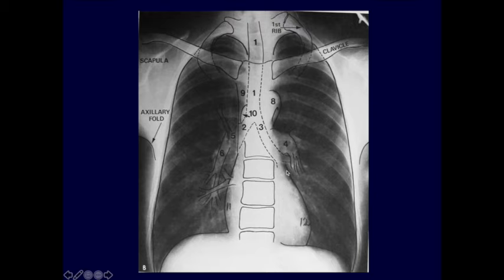I'll also draw your attention to the space between the aorta here, or the aortic notch, and the pulmonary artery here. This here is called the AP window. A for aorta, P for pulmonary artery. This should be concave. If this is convex or filled in, that's abnormal.